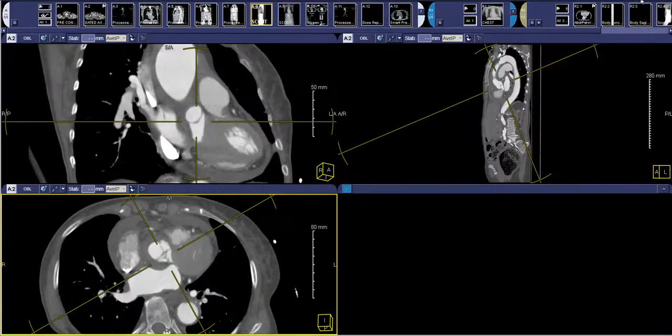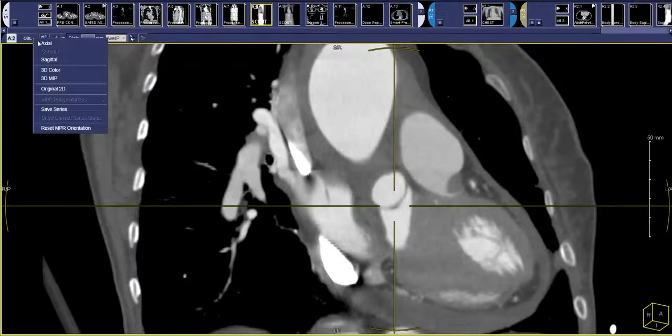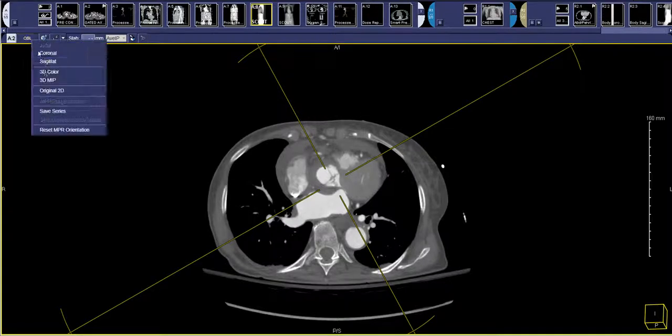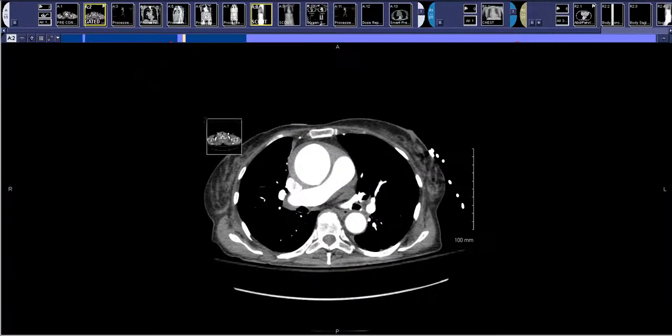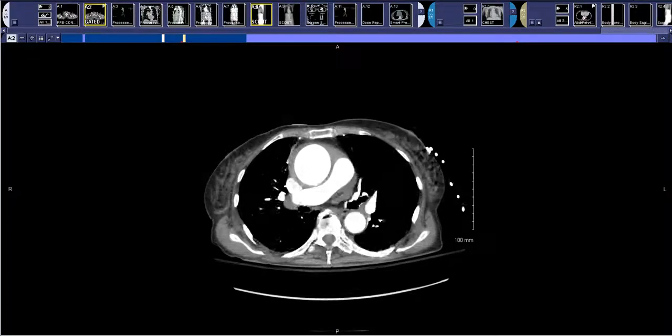One of the differentials for an ascending thoracic aortic aneurysm is a bicuspid valve, so it's always important to make sure that they have a trileaflet valve. In this case, the ascending aorta was quite dilated, and that wall weakness led to the intramural hematoma.